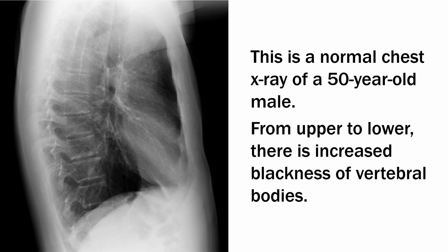This is a normal chest X-ray of a 50-year-old male. From upper to lower, there is increased blackness of vertebral bodies.